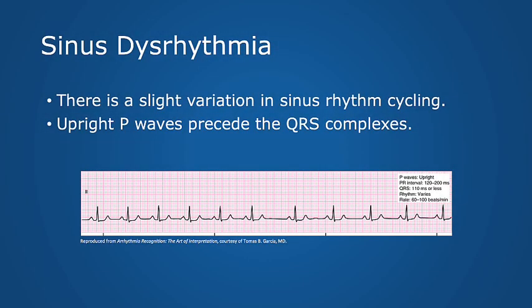All right. So the next one, the sinus dysrhythmia. The rate for sinus dysrhythmia is usually what? 60 to 100. But the rhythm for sinus dysrhythmia? Irregular. It's going to follow the rules for everything else. So this is where you've got to measure and just use your calipers or use your piece of paper or whatever, but make sure that you're measuring there. Because my P wave is going to look good, everything else is going to look good, but it's just going to be irregular.